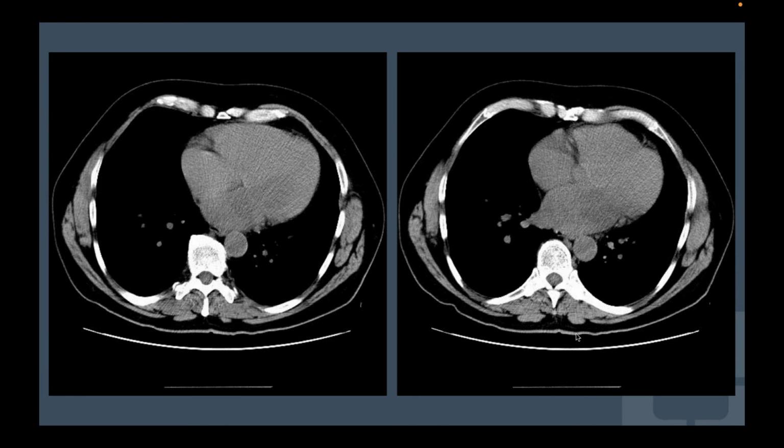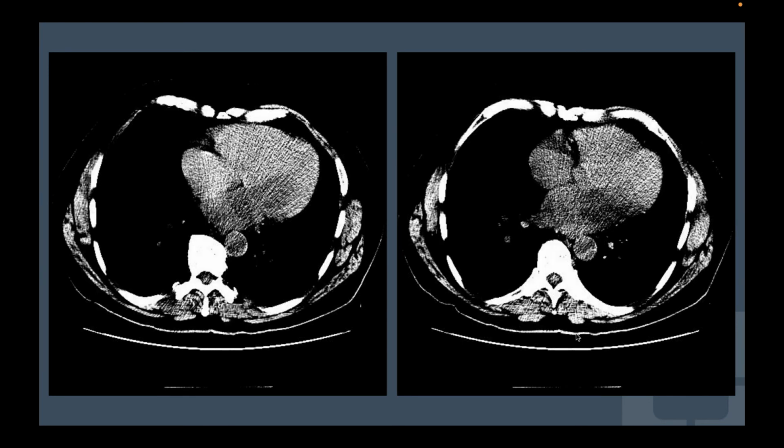All right, so we did something similar, but probably a little bit easier. We just windowed the thing differently, made the windows a lot narrower, and this is what it looked like. And we kind of convinced ourselves that there was a mass there, kind of straddling the mitral valve orifice. So we got a little bit self-confident here and questioned if there was a mass there. The patient ended up going to echo.